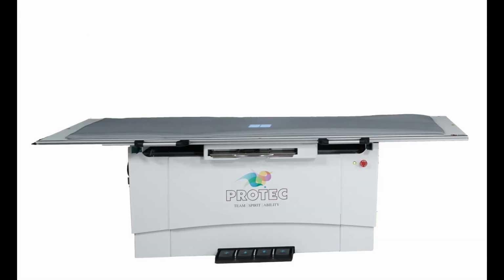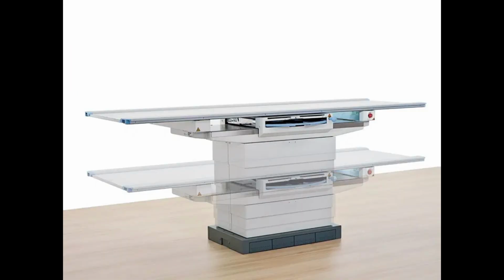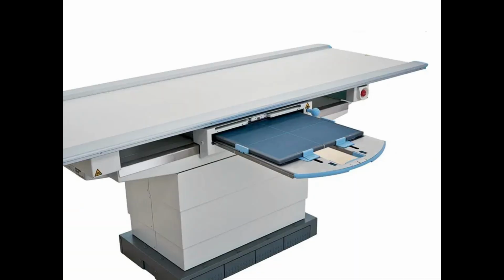5. Table. The table is where the patient is positioned and is one of the key components for positioning. Tables must be radiolucent so they do not interfere with the X-ray beam, and they usually have longitudinal and lateral movement, and in some models, tilt capability. Under the surface of the table, there is usually a bucky that is used to hold the grid and the detector. The design of the table must provide safe locking, proper weight capacity, and smooth movement, because precision in positioning has a direct effect on image quality and repeatability.